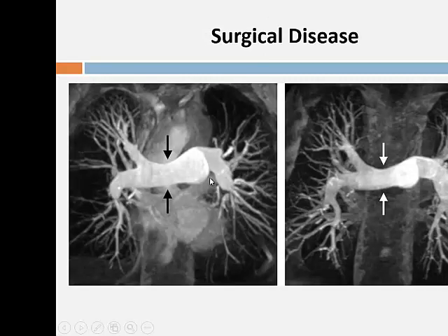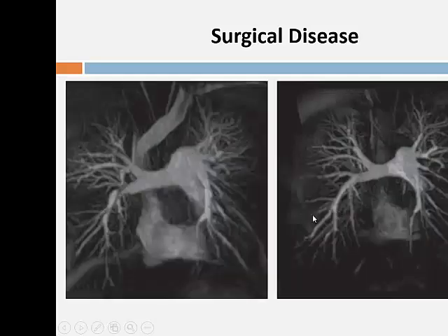Okay, so this shows you after surgery you can monitor treatment. Do you see here there's a web there? Do you see here these vessels are all cut off? Yep, and this is post-surgical, so nice result. You can see that that web's gone. Some of those peripheral occlusions have got better, and the PA's concomitantly gone down in size. Again, another web there, another web there, got a little bit better.